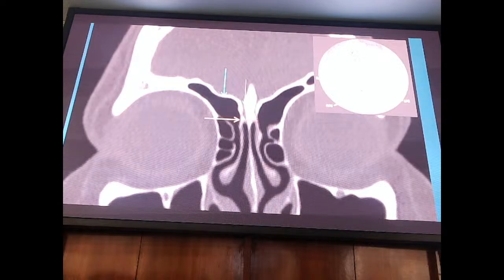Okay. Why it is called fovea ethmoidalis is because imagine it's a sunny hot day and you wear a cap. Cap is not part of your body. It is an accessory. It is just the way that the frontal bone is capping the ethmoidal air cells. That's pretty much it. Okay. So you can also see very beautifully, this is the vertical lamella, this is the horizontal lamella, and if you look at the attachment of the middle turbinate, it is at this junction.